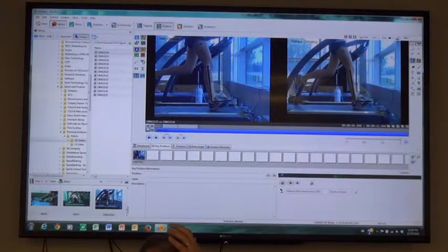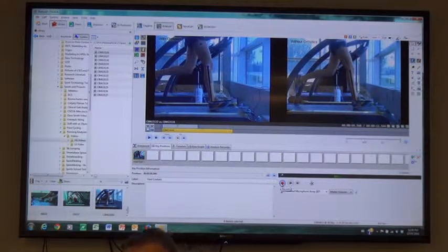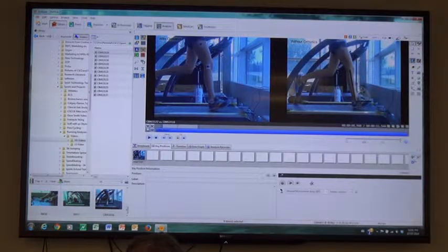So we've captured the key positions, and after we captured those key positions with the angles on top of them, we can even make audio comments here. So once my observation is done, and I'm not going to go through all the details of the observation, I would make some audio comments here based on this. So this is the key position at heel contact, okay? So I'm just going to delete those things and continue on.